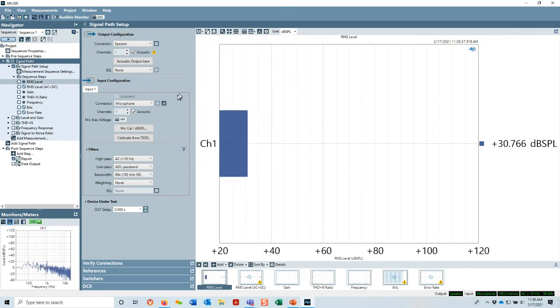And then on the input side, the connections are microphone, battery voltage, battery current, speaker voltage, telecoil current, and microphone bias voltage or CCP voltage. Now, some of these are for diagnostic purposes, and the ones we mostly use are the microphone and the battery voltage. But for example, if you wanted to measure the telecoil current, you could change that to your input connector.